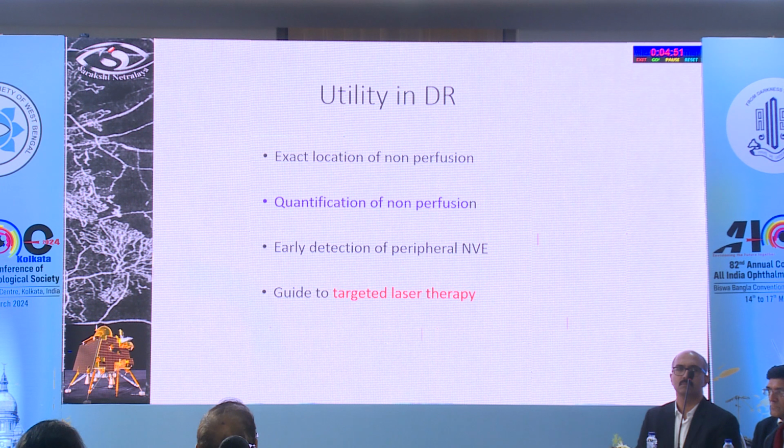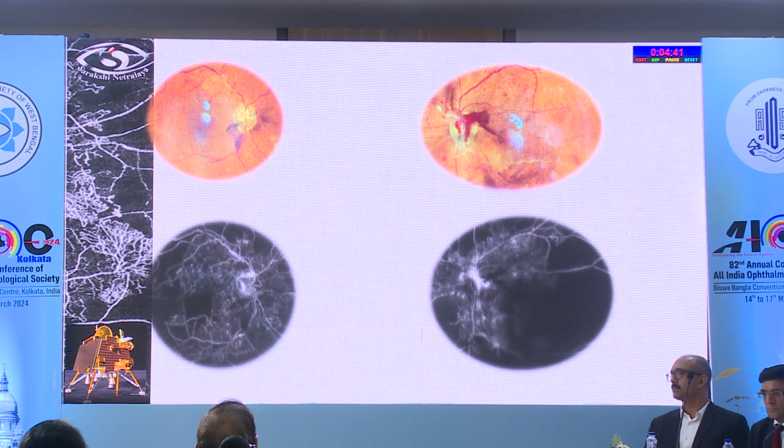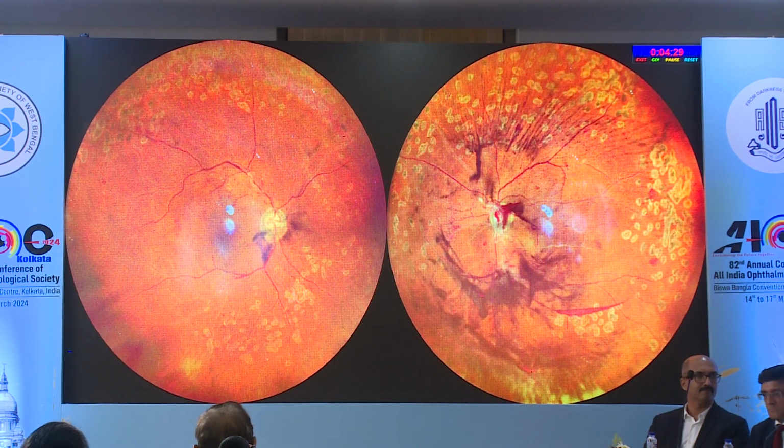You are injecting multiple anti-VEGFs, but there might be a pocket of peripheral dropout which needs a treatment and which can avoid the need of further treatment. Now this is a patient who came with these photographs. He had undergone laser and was diagnosed elsewhere to have a capillary dropout, and there was a bleed. And look at the difference, stark difference.